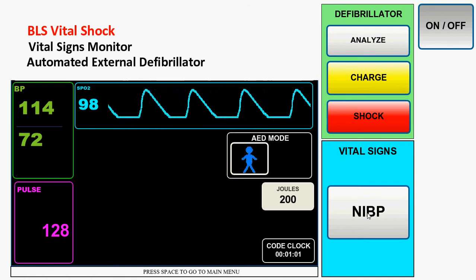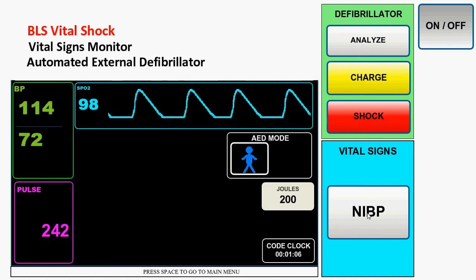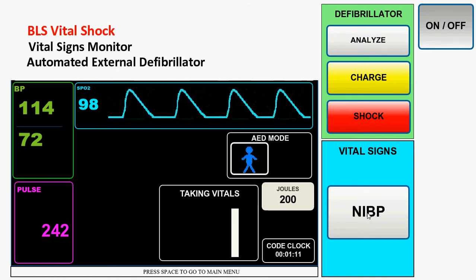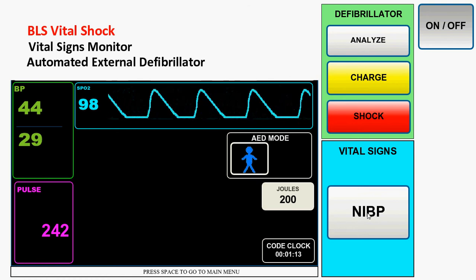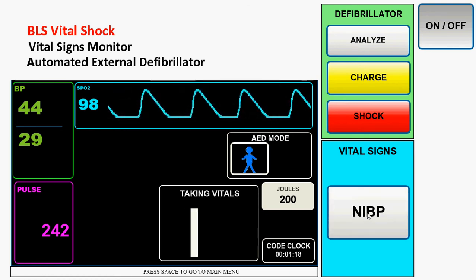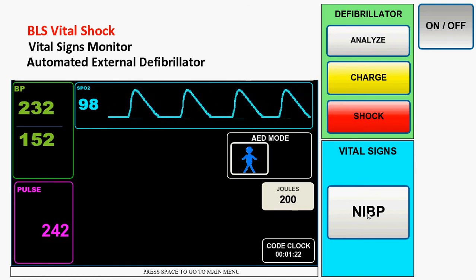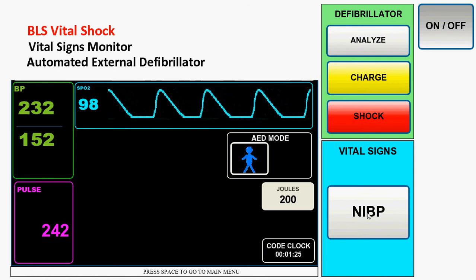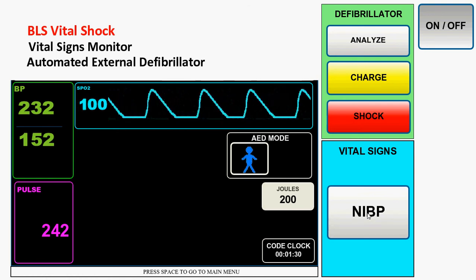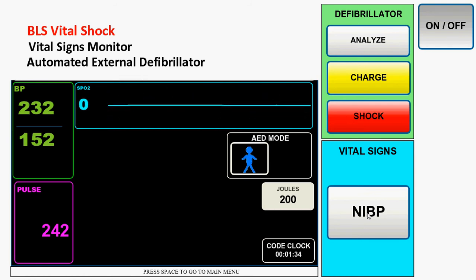The ranges are pretty broad, so we have like profound bradycardia to significant tachycardia. We have lots of blood pressure ranges too, so I'm going to show you each one of them. So there's perhaps very profound shock or maybe neonate, and then we have something along the lines of having a stroke or perhaps a significant head injury. Likewise for SATs, you can have low SAT, you can have high SAT, you can of course also have probe fell off the patient.